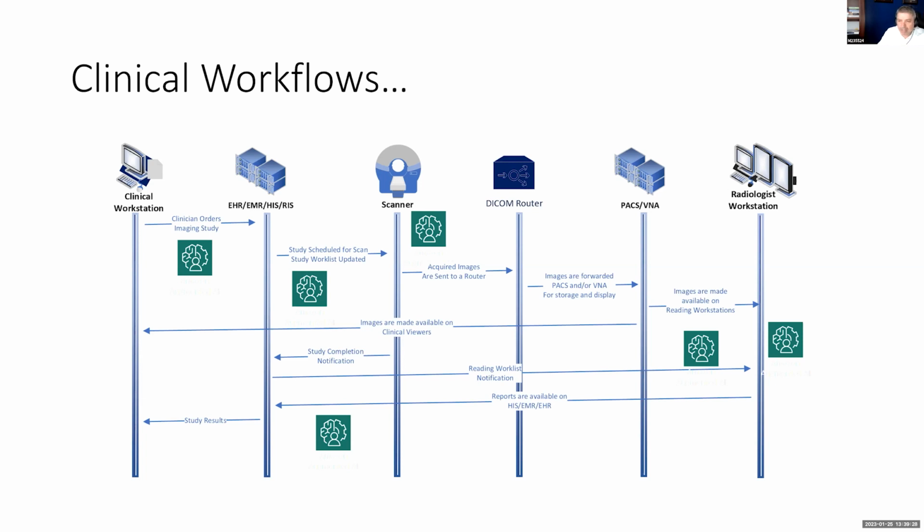Your incoming study might be a DICOM series, but you might be producing a result in DICOM SR to trigger voice recognition software, or an HL7 message to trigger a worklist item, so your image can be seen and the reader knows that you have an AI finding they need to pay attention to and act upon.